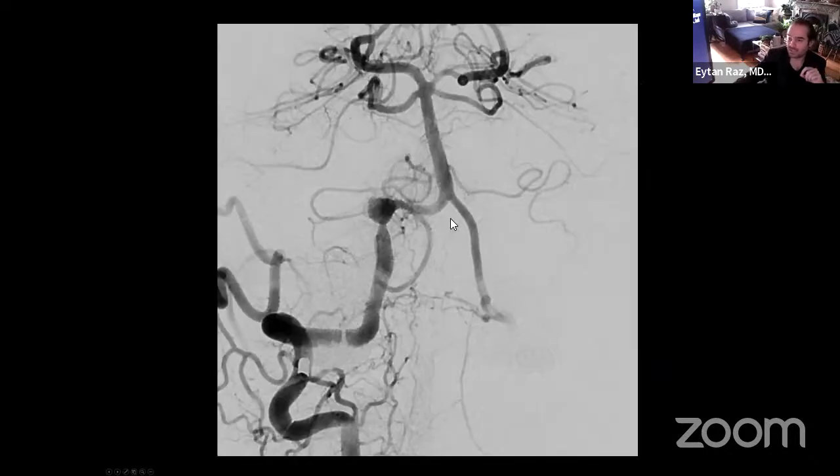Another patient with a subarachnoid hemorrhage, diffuse but also in the posterior fossa, an obvious dissecting aneurysm of the intradural vertebral artery, codominant, a little dominant on the right, but certainly this is a patient that can sustain the flow using only the left vertebral artery. You see a PICA coming from here, right? So this is a very reasonable situation to sacrifice this vessel, close it off, cure the aneurysm, and that's it, right? Can you just do it? Yes, certainly you can just do it.